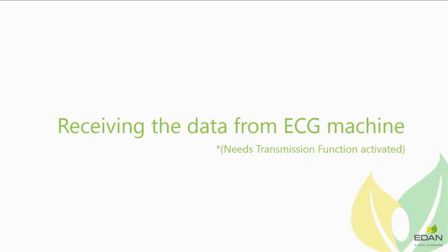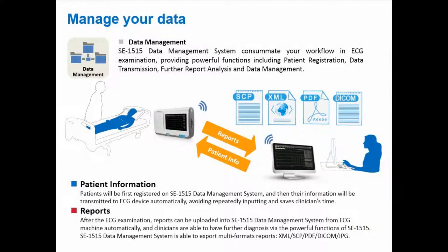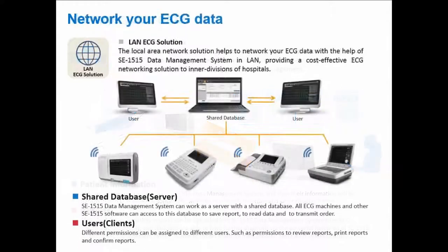Receiving the data from ECG machine needs the transmission function activated. The transmission function of SE1515 helps to network your ECG machine with the ECG data management system, providing a cost-effective ECG networking solution to interdivisions of hospitals.